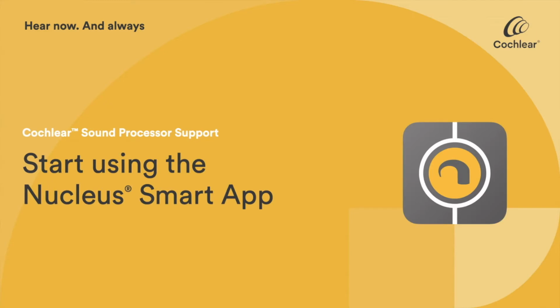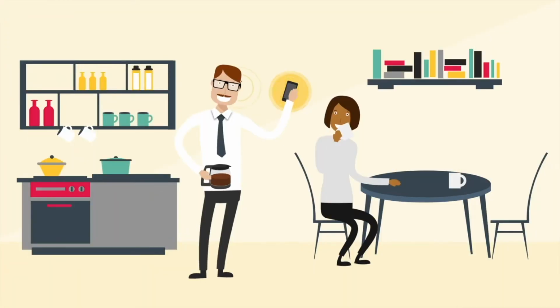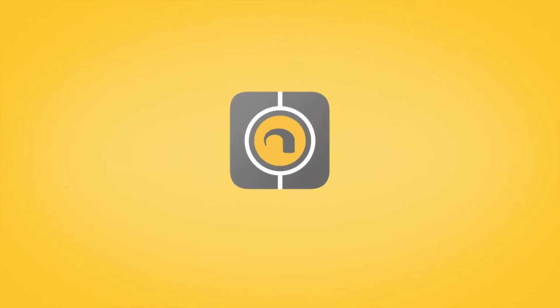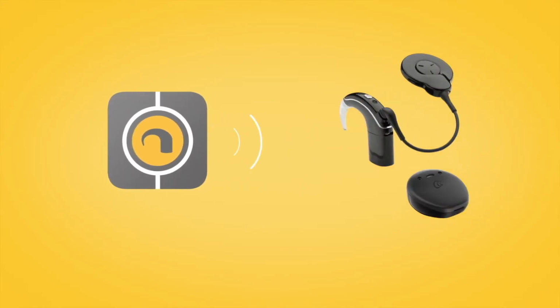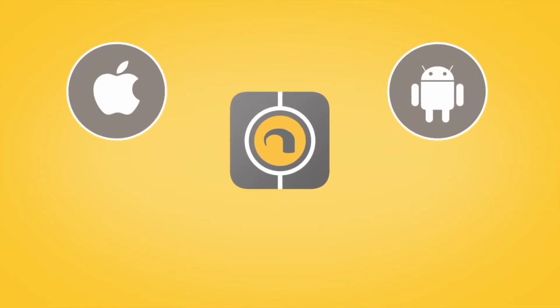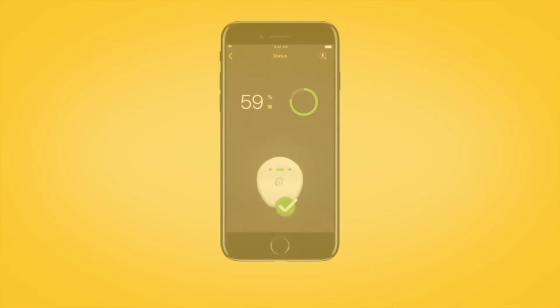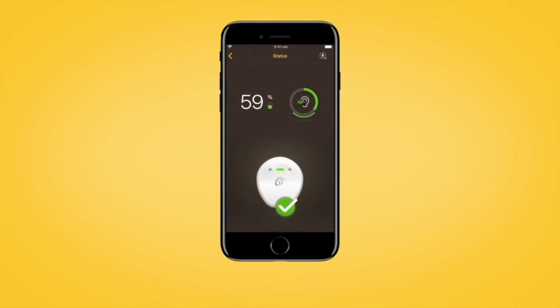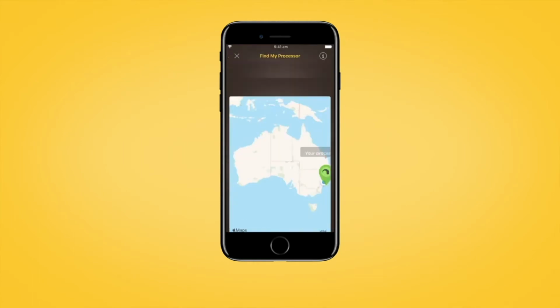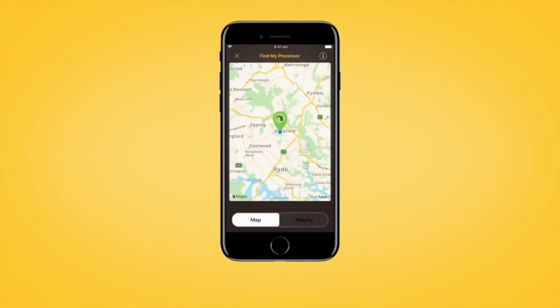Designed for the Cochlear Nucleus 7 and Kanso 2 sound processors, the Nucleus Smart App is the first ever mobile application to control a cochlear implant sound processor directly from a compatible Apple or Android device. You can monitor the status of your equipment and battery life, and for added reassurance, the Find My Processor function can help you to locate a misplaced sound processor.